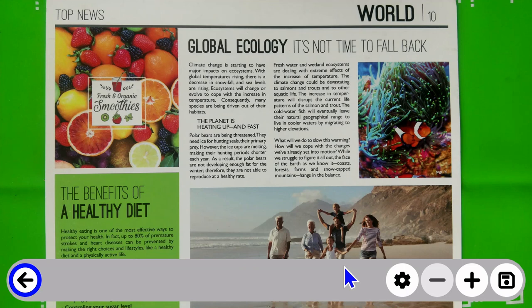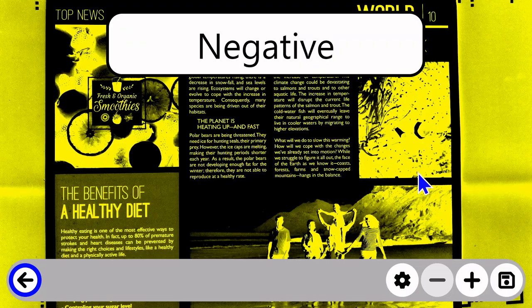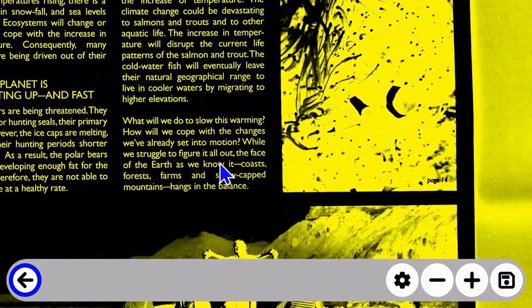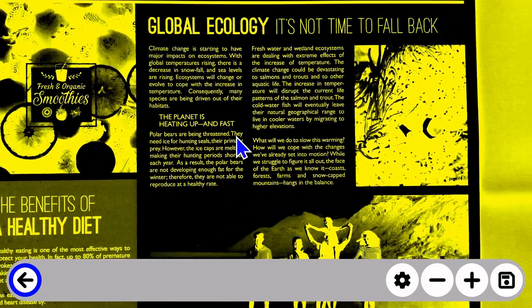If I do, remember I've set my contrast. Let's use that gesture. There I am. So I can still switch this, but it is an image now instead of a live document, which allows me to do things like click and drag or use a finger to move my document around on the screen.